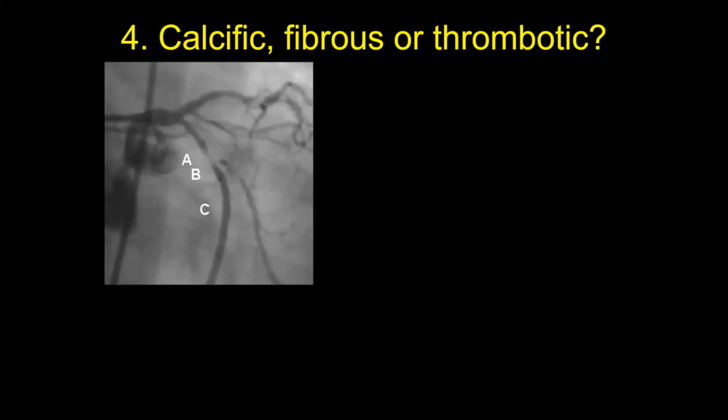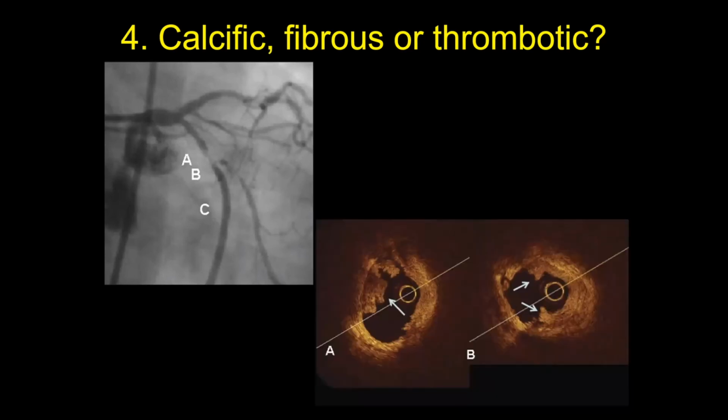It looks to be calcified artery. Okay, Nishad. You want to change your answer, Ahmed? Yeah, it's a thrombotic. Thrombotic, yeah. There is a thrombus, and it looks like a white thrombus.